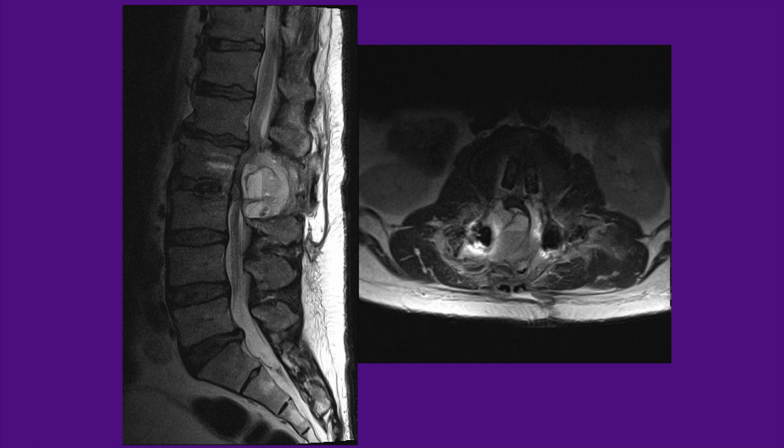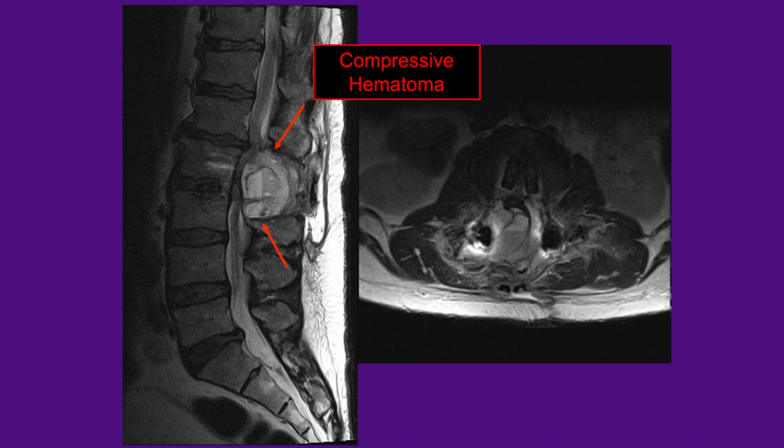Here is not an uncommon case where the patient has symptomatology following surgery, and when we do imaging, we see a large postoperative hematoma, which is resulting in compression of the neural elements.